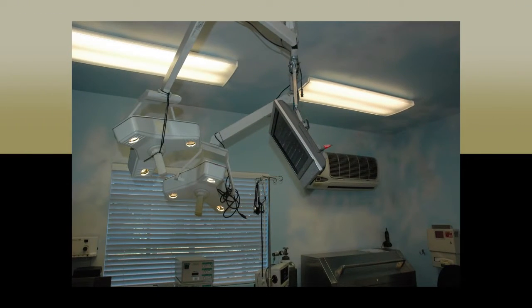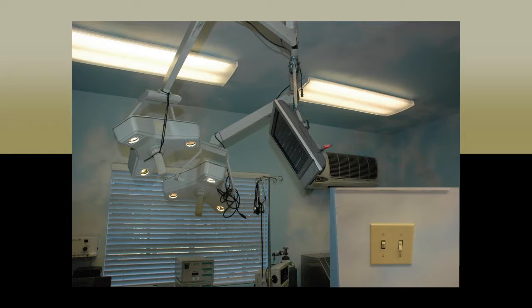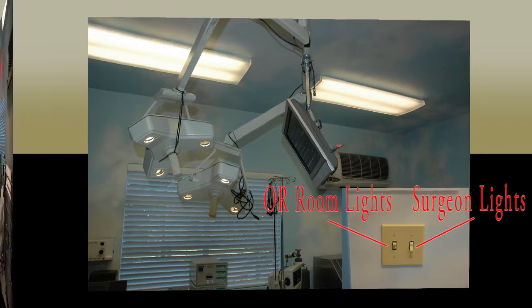Above the OR table, you will see a set of surgical lights. They are on during surgery, but they are to be off between cases. The switch to do so is located on the wall to the left, just inside the door as you enter, on the north wall. The switch on the right turns on the lights for the surgeon, and the switch on the left controls the lights for the room.